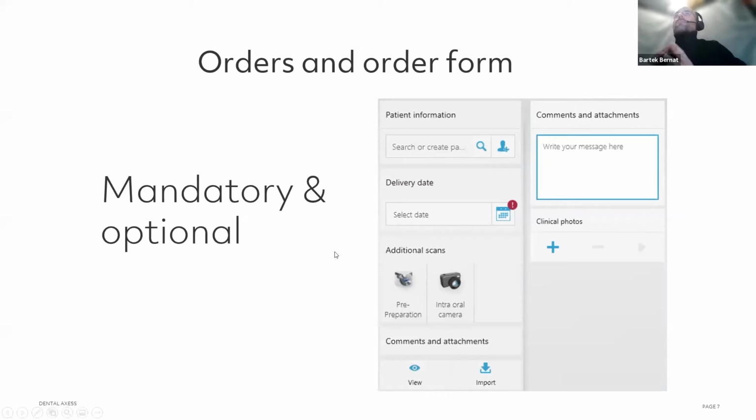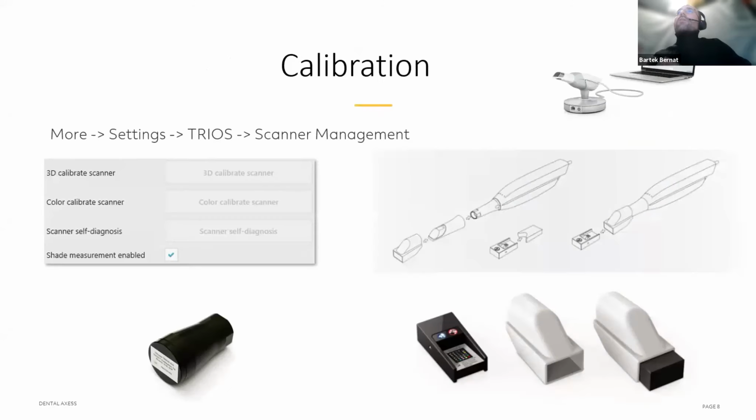Okay, good. So we have covered that. This is a mandatory and optional part of the order form. Now we're going to go to the very important topic of the calibration.